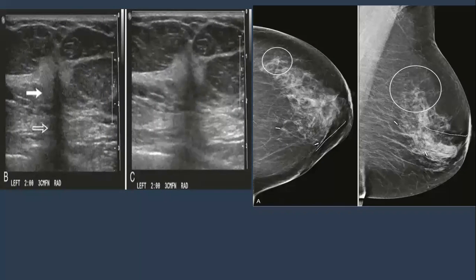It demonstrates shadowing lesions. What is the difference between the two ultrasounds? Here on the left side, the acoustic shadowing is more. Maybe harmonics were added to the right one.